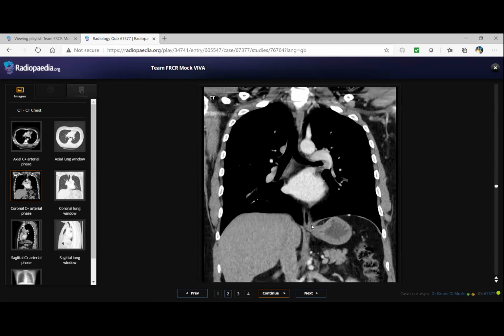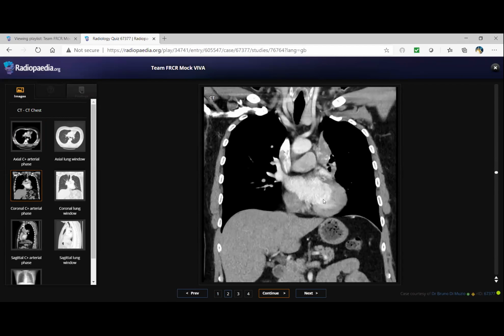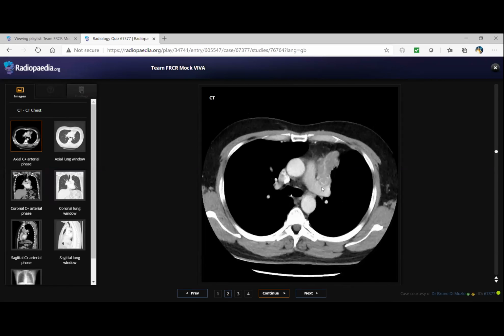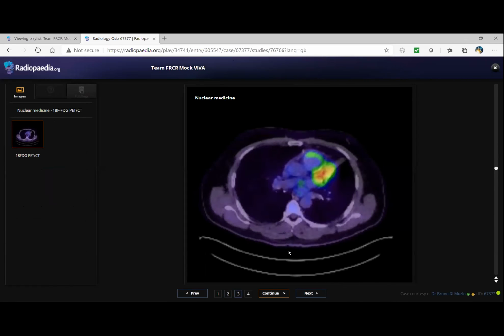Okay. So I will just review the cases. This was a case of, on the plain radiograph, as you mentioned, left upper lobe collapse, and that's an endobronchial lesion, as you can see here, and it's enhancing. Here is the lesion. So it's an enhancing mass lesion, and then just to know that you should go for an FDG PET. If it's a well-differentiated tumor, then it will give you a negative finding, but if it's poorly differentiated, it would appear on PET.